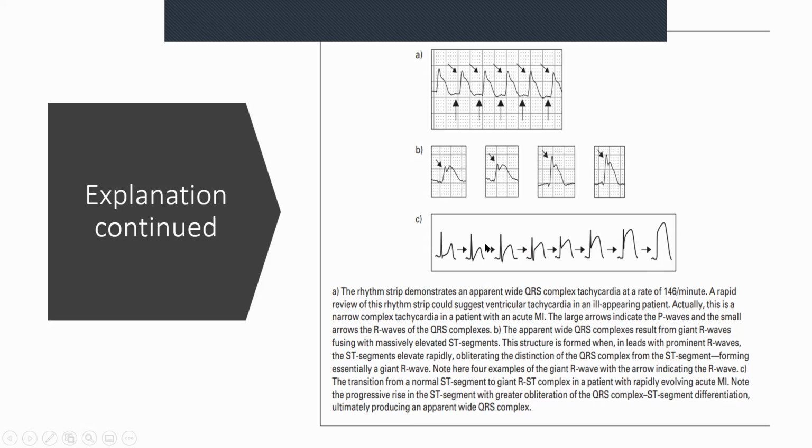All along here, it's probably an easier distinction that it's an ST segment. But once you get towards the last 2, that's when it really starts looking like a tombstone. Tombstone elevations are very worrying, and like I say, they show rapidly evolving and very serious MIs. These patients often need to be thrombolyzed or taken in for a PCI quite quickly.